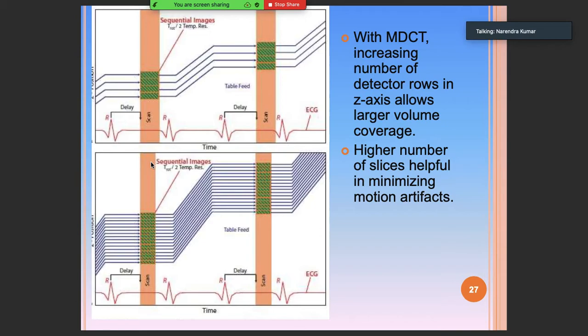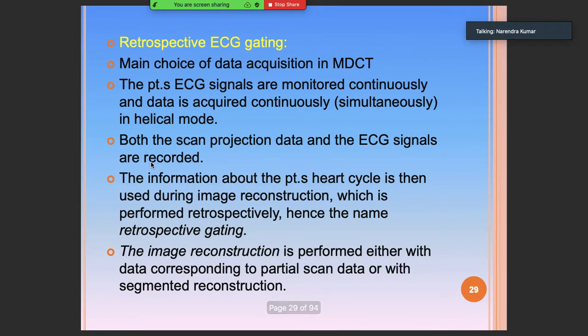For the scan technique, the tube current in milliamps for the calcium scoring protocol can be pretty low, and each data set is obtained during the most optimal ECG signal to reduce the motion artifacts.